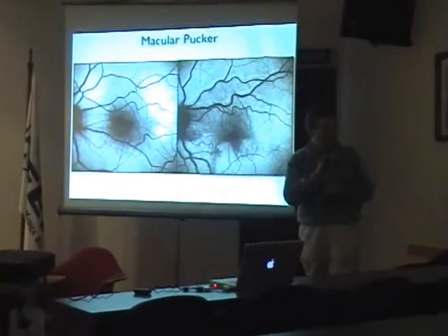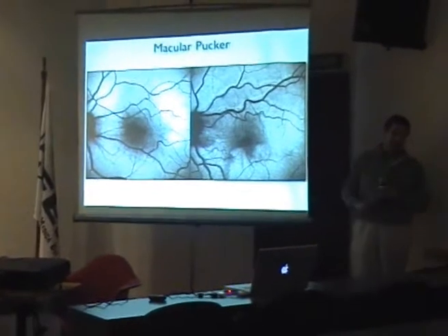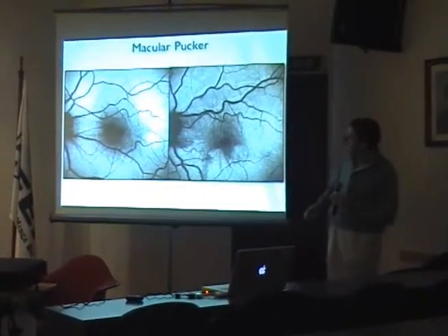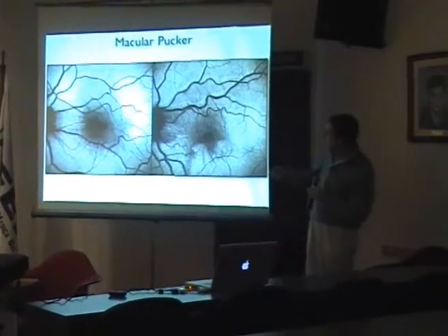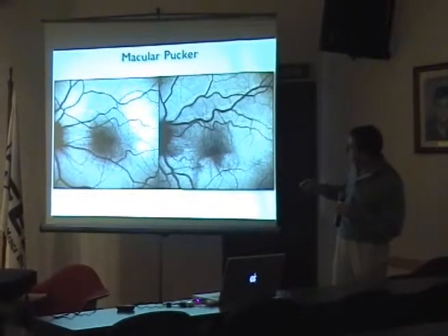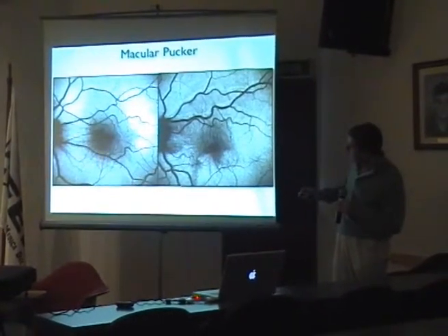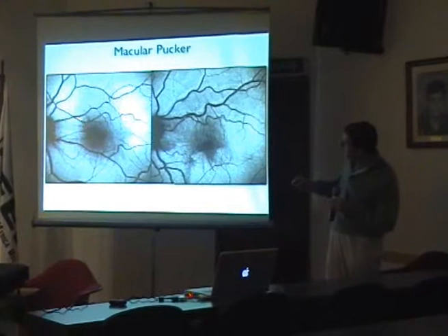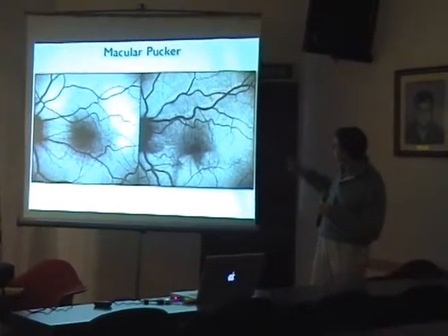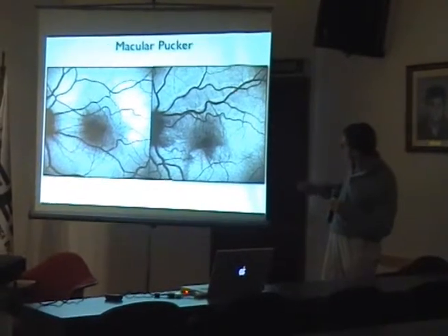And this is really a unique case. What is strange in these two images? I will try to show you. You see this line? You see this line? There is actually another line here, and here, and here.